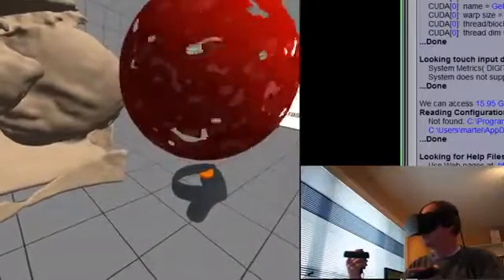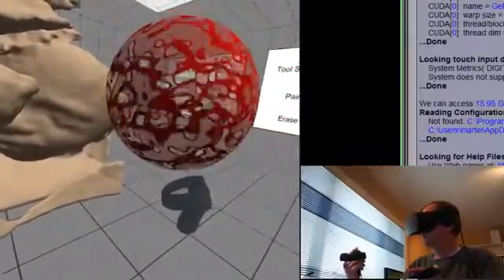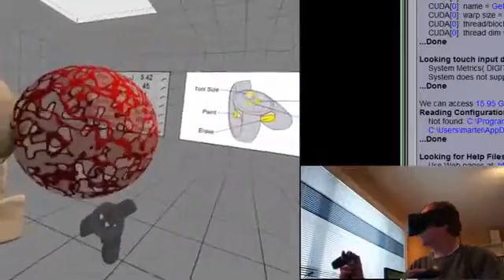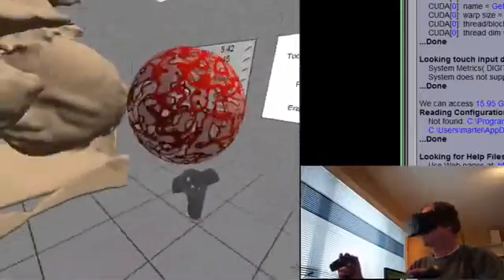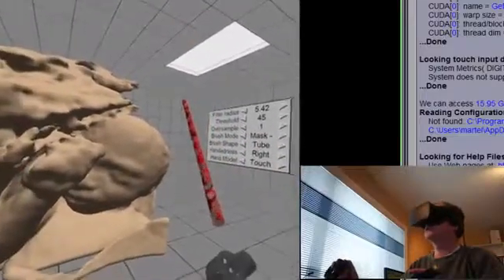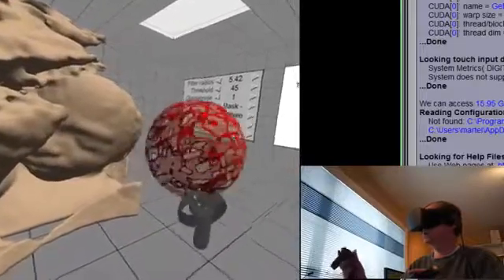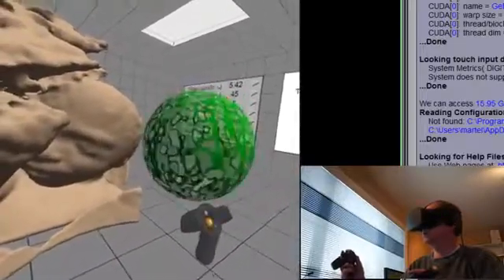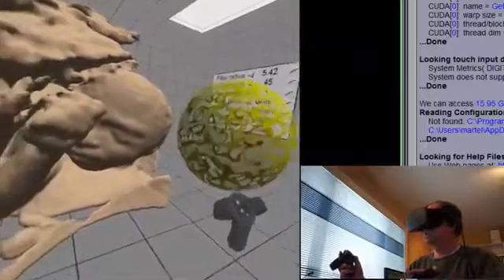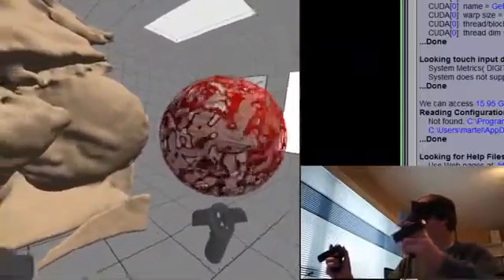With the trigger on the tool I can change the opacity of my tool here, and I have a choice of tool shape: a sphere, a disc or a tube I can use to edit my surface, and I have also a choice between editing the mask or the gray level values. This is explained a little bit in the other tutorial on edit.